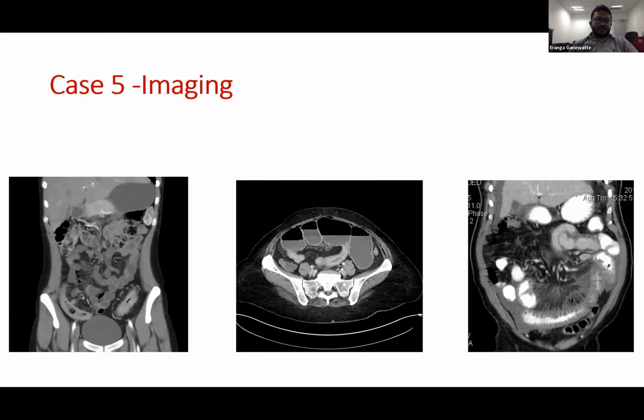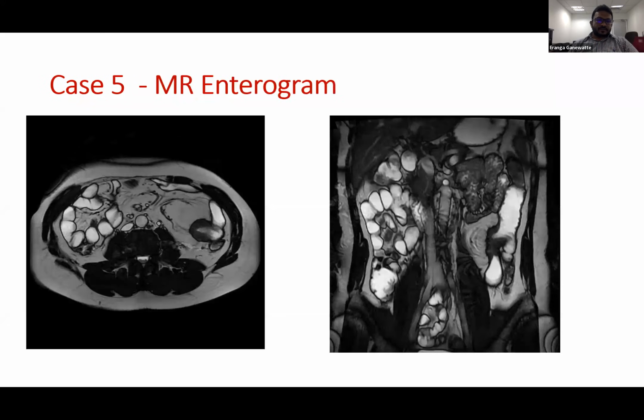And if you move on to the MR images, it will be the same, but for MR you usually give some anti-spasmodic like Buscopan, because motion will give artifacts in MR. The sensitivity will not change between MR and CT enterogram if you do it with proper technique. And here also you have to give 2% mannitol. So the ingestion would be the same, just the machine technique is different, but you can see these strictures nicely on MR as well.